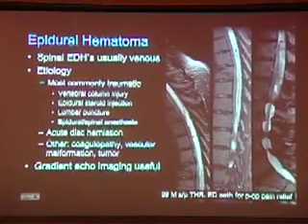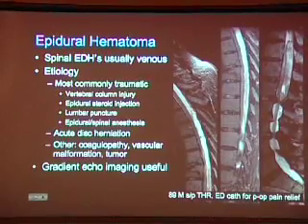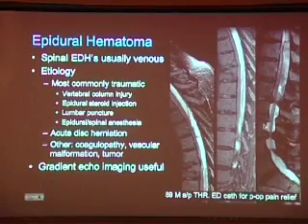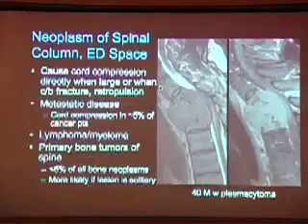You can see that this heterogeneous epidural hematoma extends all the way down his thoracic levels and into the upper lumbar region, where, by the way, he also has horrendous multi-level spinal stenosis, and this patient required a large multi-level laminectomy to evacuate that epidural hematoma.